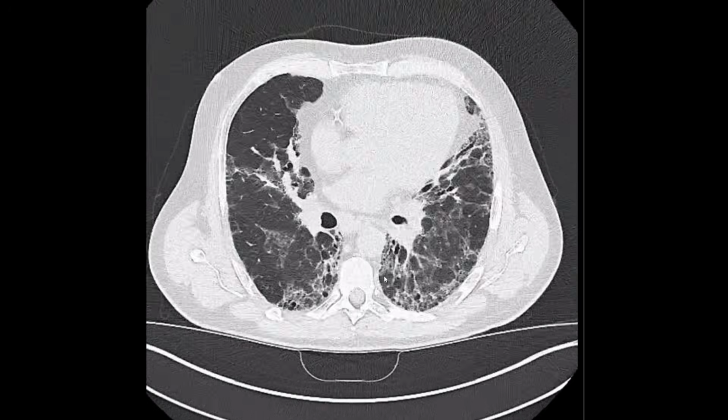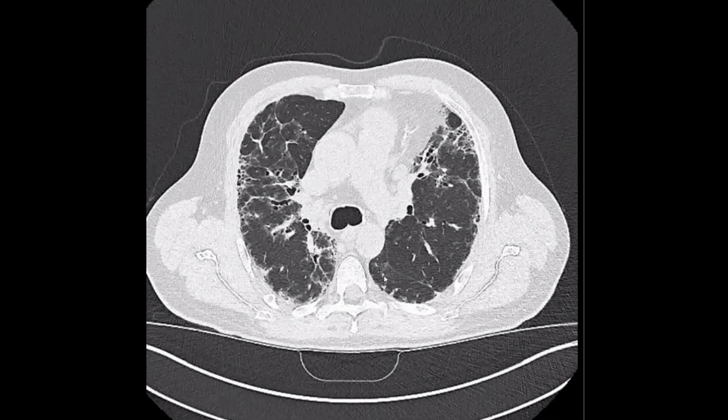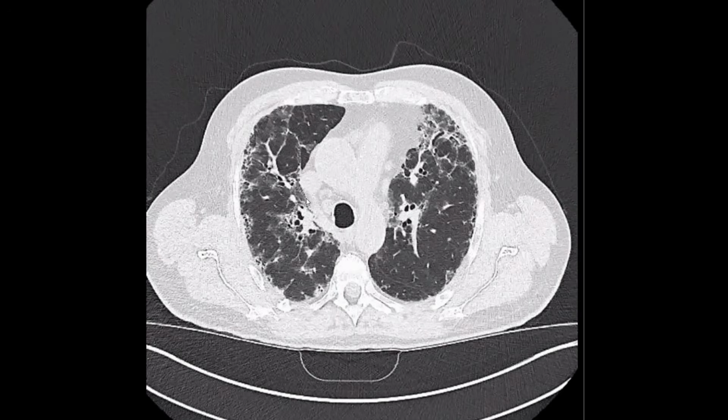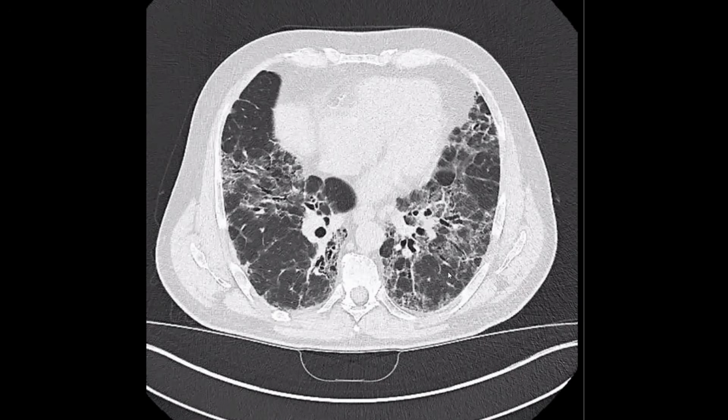If you need to do an expiratory phase, you will do it. If you are searching, for example, for subpleural sparing in NSIP, you can ask to do a prone CT. In this one, you should suspect that we have some sort of air trapping. You should ask to do an expiratory phase and prove that we have air trapping. So we have coarse reticulations and fibrotic changes associated with air trapping.